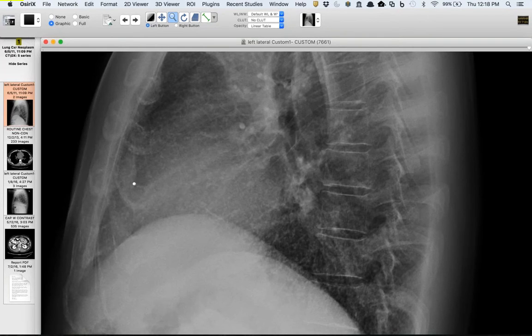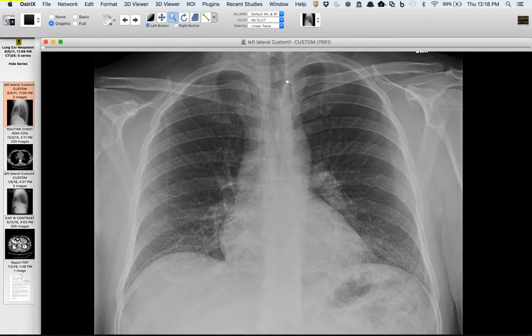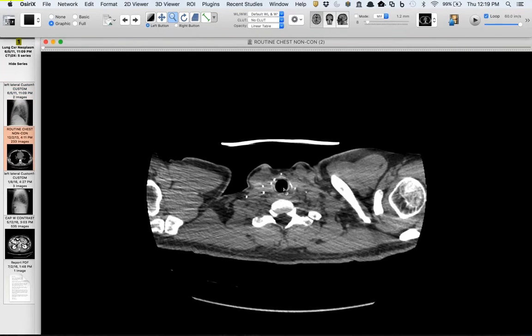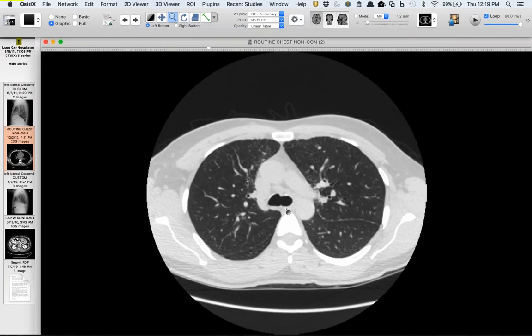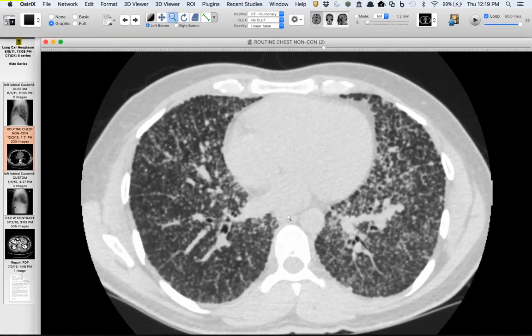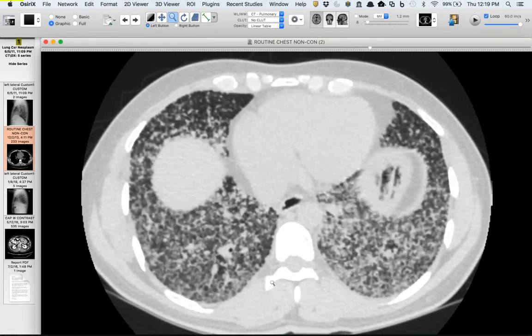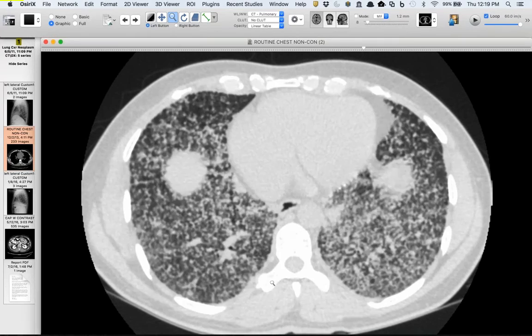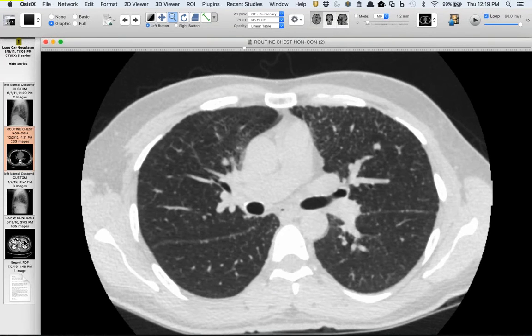And this was back in 2011, and there's one other finding here on the radiograph, which actually gives a clue to what this turns out to be, and it's this subtle tracheal deviation to the left with something. And it's not just a goiter that's here. And I'll show you, this is a CT from 2 years following, and so you can guess he's had a thyroidectomy at this time, so you probably guess what he has. And he has some larger nodules in the upper lobes, but just to show you how much miliary metastatic disease from thyroid cancer there is, and this was papillary thyroid cancer, and just how gravitational dependent it is. It's really quite remarkable.